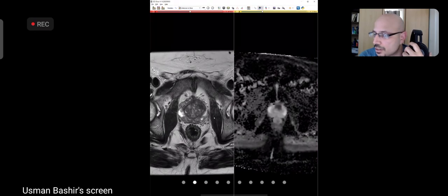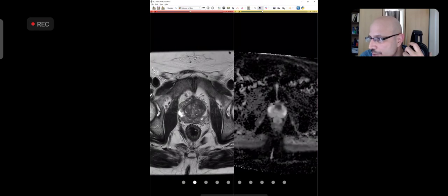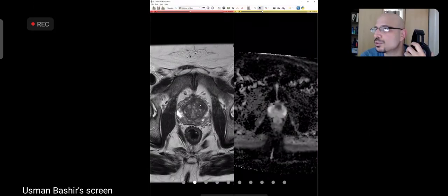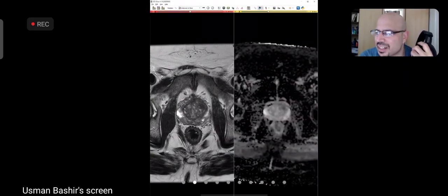Anyway, so now you see this is the glandular tissue. You see the cystic stuff, bubbly, and then this is dark. This is dark too, but you see it is just that slightly... I'm gonna link both of these together. If not PI-RADS 4, you say it's PI-RADS 3 because you say, okay, it's a bit asymmetric. That is a normal band of anterior fibromuscular stroma on the right side. It's a bit thick, and I'm not seeing those cystic sort of architecture there. So this is PI-RADS 3.